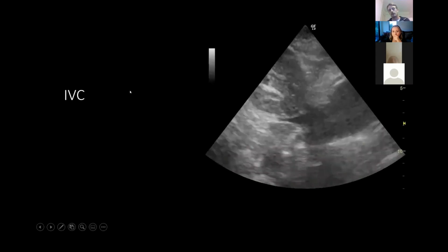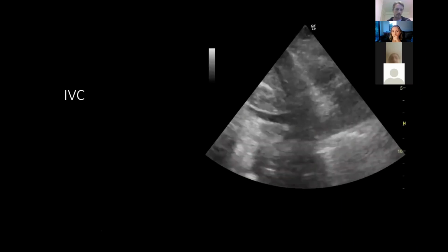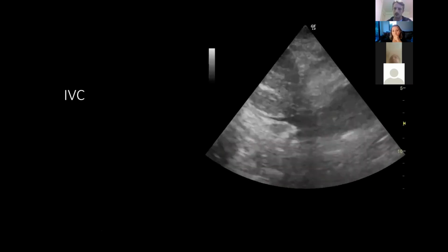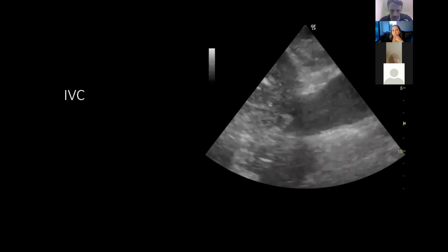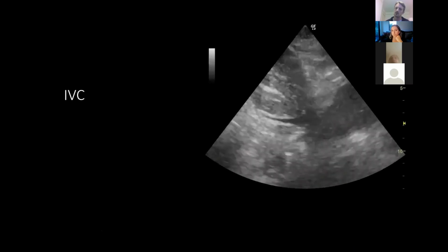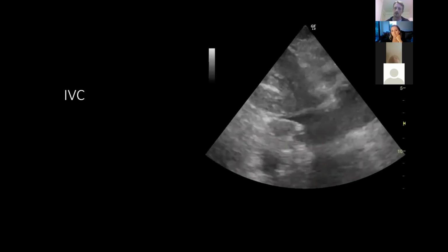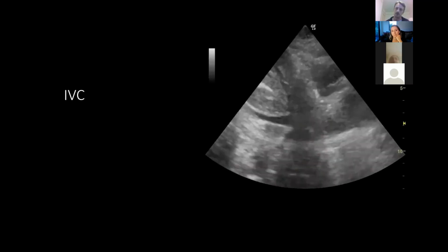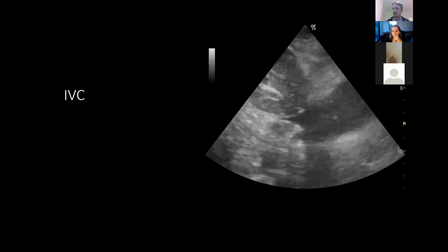Okay, and then we look at her IVC, and her IVC is pretty much flat as a pancake. Kian McDermott did a really good talk on IVC, which I'd highly encourage everyone to listen to. It's on YouTube. I have a bit of a bugbear about the IVC, and I'm not going to go into it in too much detail, but I think we would probably read too much into the IVC for fluid responsiveness, and I think we're a bit behind the evidence on this. The IVC is a surrogate for CVP, which makes it a surrogate for right atrial pressure, and we've got to be a bit wary of interpreting it as much more than that.